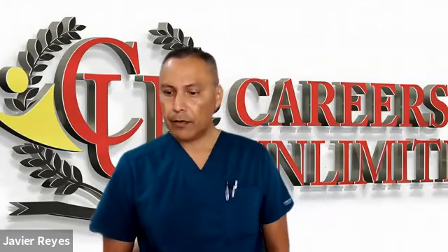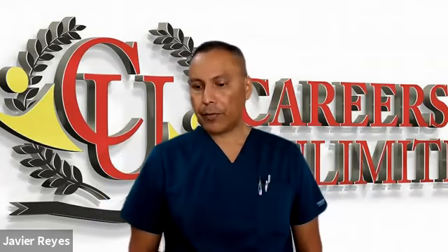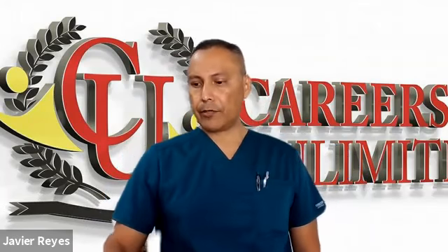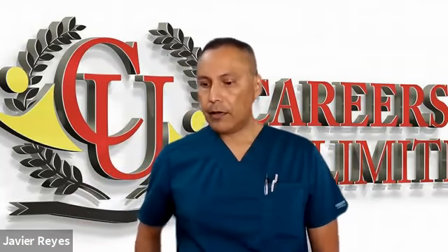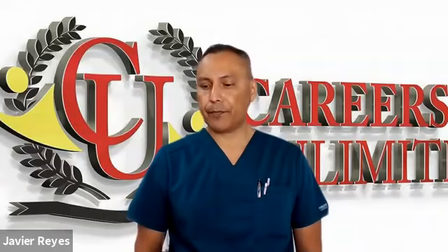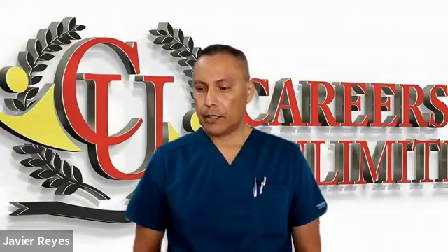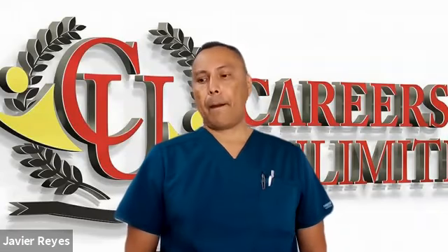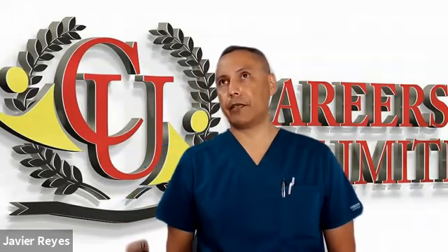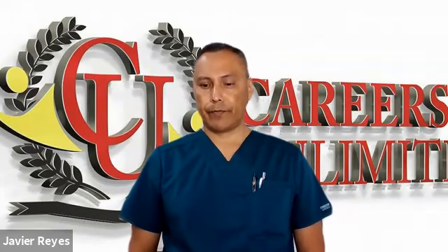And letter B is what? What could we call letter B? There are P waves. It's regular. You get calipers and they look pretty regular. The QRSs look within the normal range of 0.06 to 0.10. So then what would we call this one? This one would be called a sinus bradycardia because everything is normal about it except the heart rate. It's low, less than 60, so that makes it a bradycardia. Right?